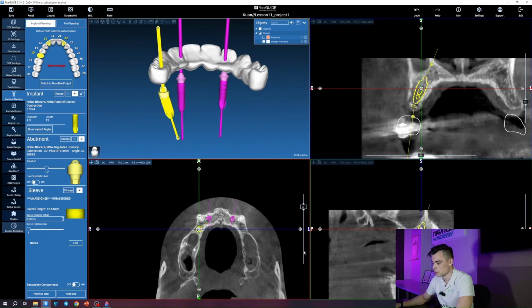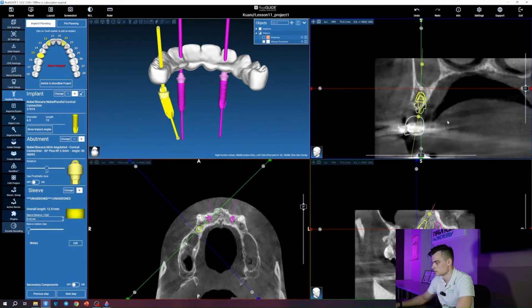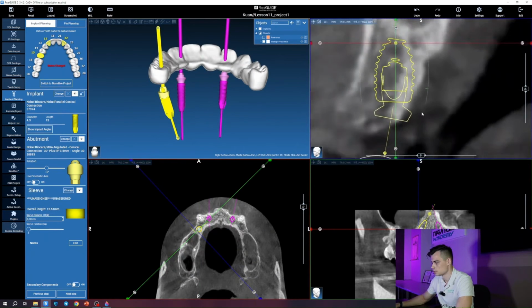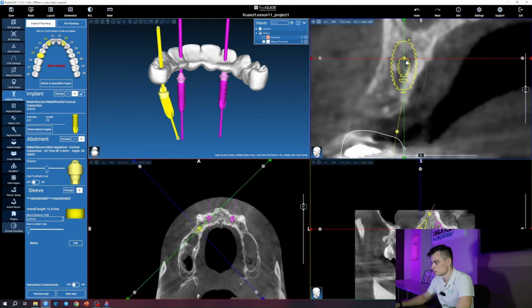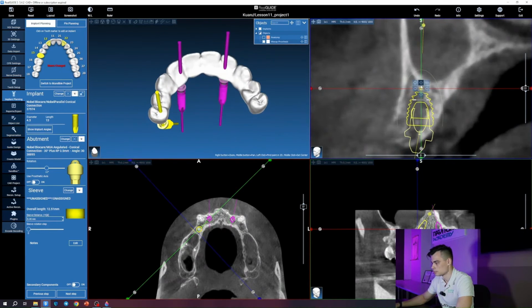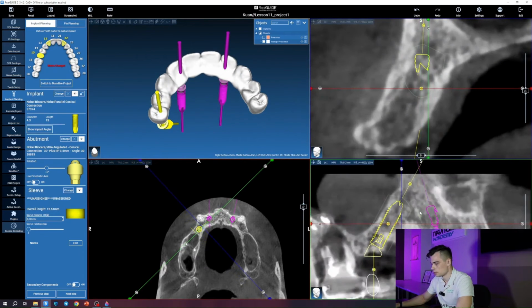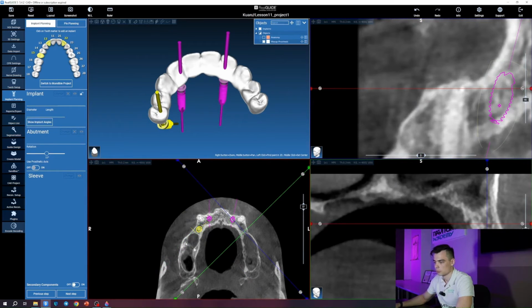Well, let's say, okay, by the way, let me check here as well, but here, of course, it's a bit too close to the cortical plate right here. But overall, I'll move it just a little bit more like this. There, I think that's fine. Everything looks good. Let's double check here as well on this slice. Everything's okay here too. And now we move on to the 2.5.